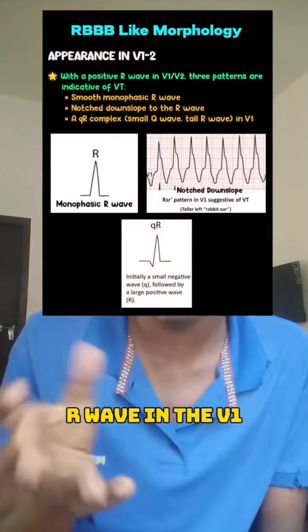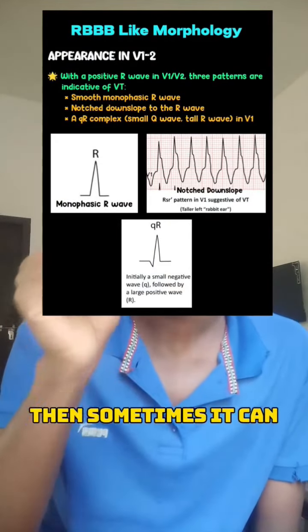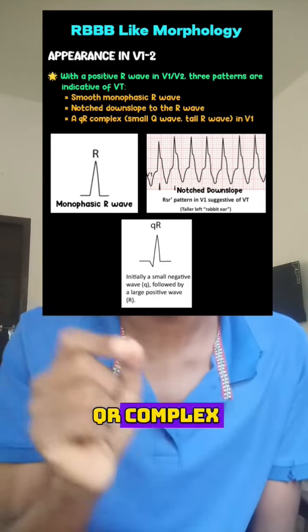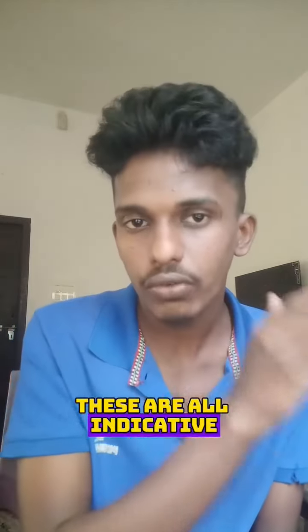You identified a dominant R wave in V1. So a positive R wave in V1, and sometimes it can be a monophasic appearance, sometimes a notch can be present, sometimes there will be the presence of a QR complex, that means a small Q wave and a tall R wave. These are all indicative of ventricular tachycardia.